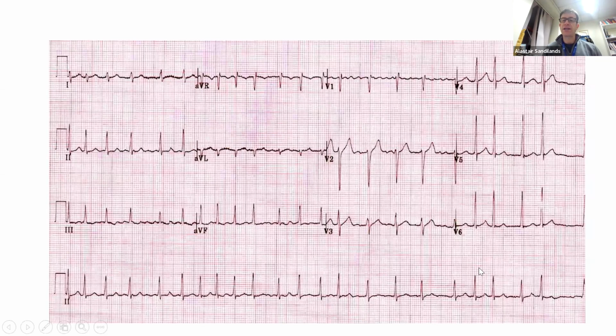So is this a tachycardia? Yes. Is it a narrow QRS? Yes. Is the rhythm regular or irregular? Clearly irregular again. So we need to think about, is this atrial fibrillation? You can see now much more clearly in V1, the best place to look, a very variable baseline. This is not atrial flutter. This is not flutter. This is coarse atrial fibrillation. This is not continuous or fluttery enough. So, again, having a look at the leads.